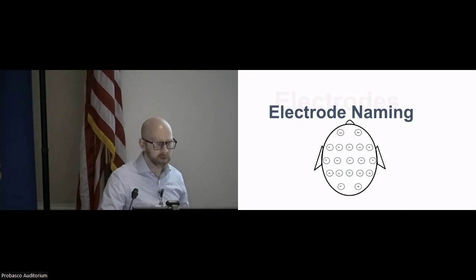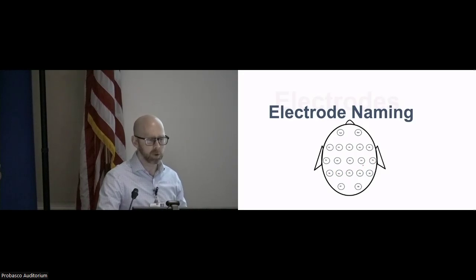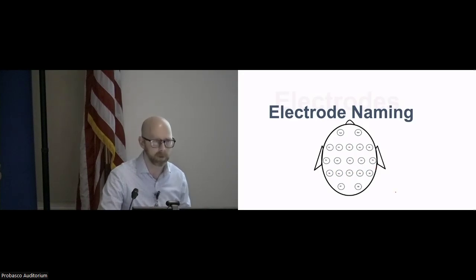When you have something in this region, there's not a lot of coverage for parietal, so temporoparietal is pretty common. If you see a discharge, you look around this area too. This is just to give you a general overview. And of course, dead center are the Z electrodes. That's just to give you some orientation to what you're looking at if you've never read an EEG before.